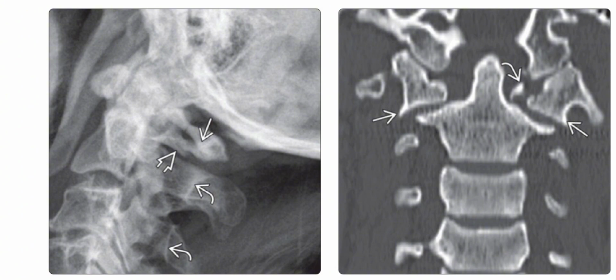Right is the coronal reformatted bone CT, and it shows the coronal displacement of both the C1 lateral masses. Also seen is a bony fragment due to the transverse ligament tubercle avulsion.